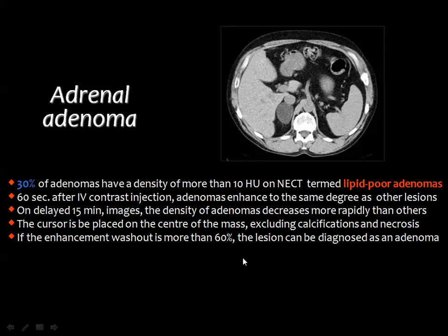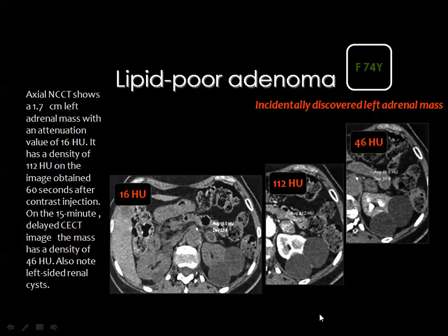Then the only difference between lipid-poor and the lipid-rich adenoma lies in the pre-contrast scans, where the density is higher than 10 Hounsfield unit. Then look at this example.